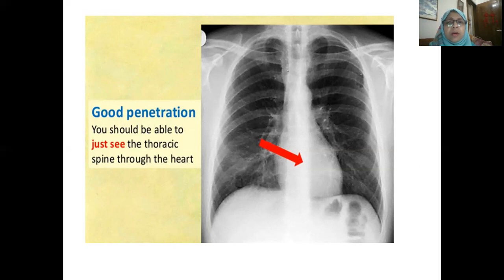And you have to know lots of things on X-ray chest. You have to know how to read an X-ray chest, and how you can define the upper zone, middle zone, and lower zone. What is hyperinflation, I have explained. And you have to know cardiomegaly and how to explain that the cardiac shadow is enlarged. This is a vast subject, how to read an X-ray chest.